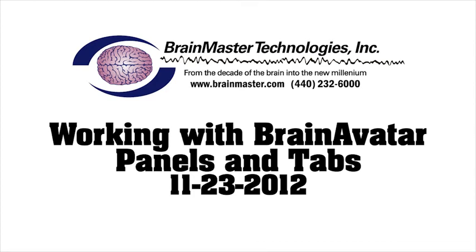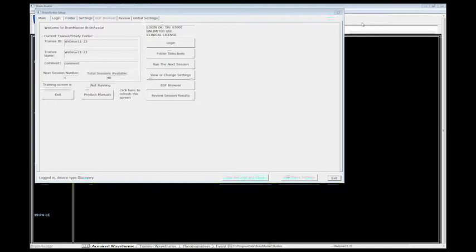What we have done in this software that's a little bit different than our previous versions is given people the ability to control what's being displayed on their screens. It's a nice little feature that is not really utilized that much, and that's partially because not a lot of people know what's going on with it.